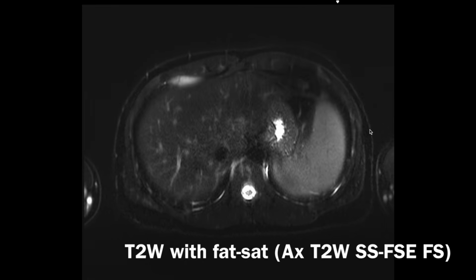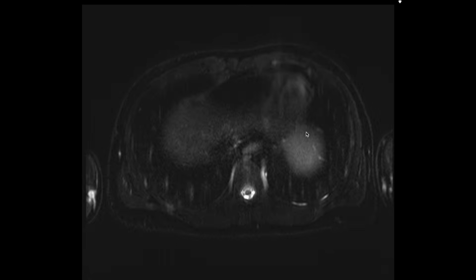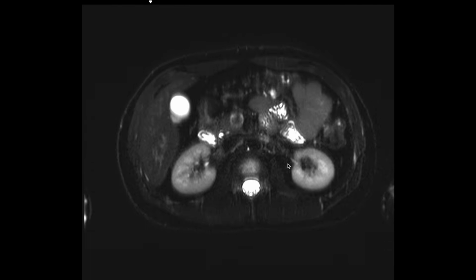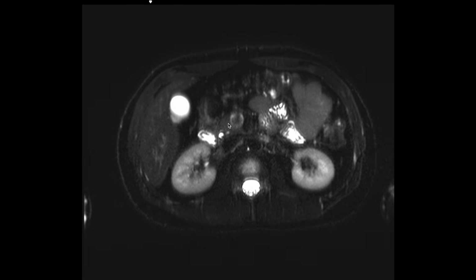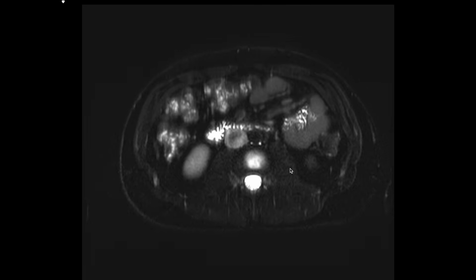Next, we generally perform a T2 weighted image with fat saturation. This happened to be done as a single shot fast spin echo as well. This was a HASTE image, and so you can see that because all the fat is so dark, the fluid signal stands out quite a bit more. So you're going to look for things like edema. For example, if there was pancreatitis, you might see a lot of bright signal in the fat surrounding the pancreas that we wouldn't have seen on the earlier T2 weighted images. So the fat saturated T2 weighted images are really good for looking at fluid and specifically edema.